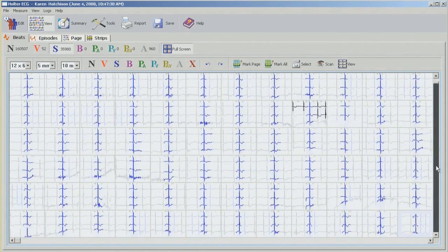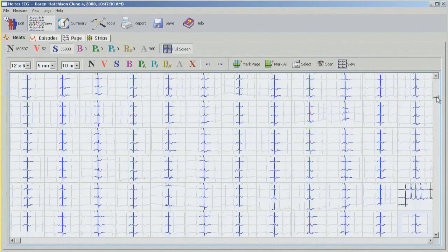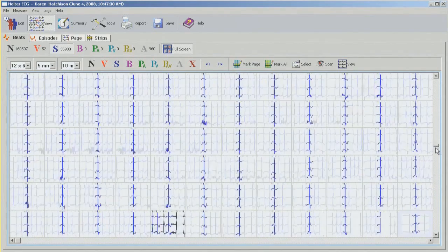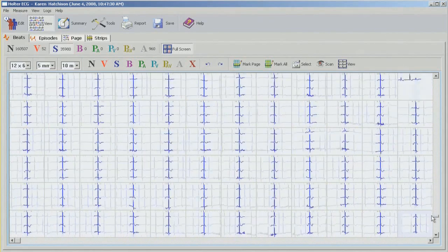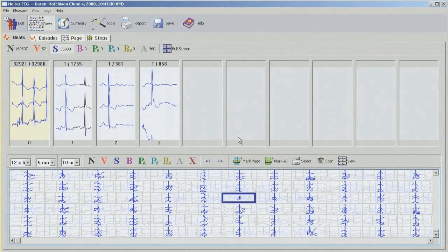It's going to be a long process with 35,000 beats, so I'm just going to quickly drag this down. All these should be labeled correctly, but I just want to make sure there's nothing missing in here. So I'm happy with this bin. Again, tag any of the boxes and use the Z button to get out of there.